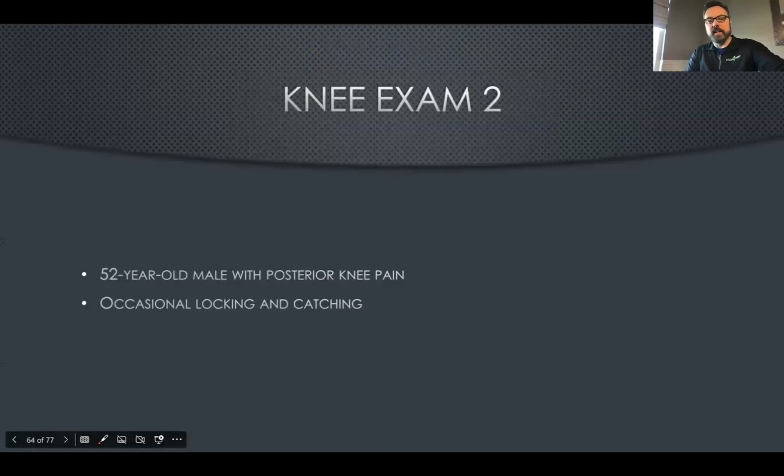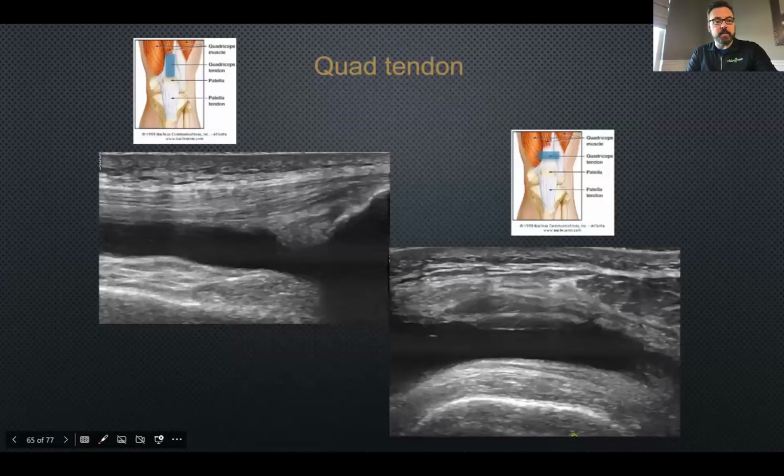Okay. Another knee exam, this case I like a lot because there is MR correlation. This is just above the patella in that suprapatellar recess. You could see it right here as long axis and then short axis. And what we see is this big dark spot. That's all fluid. That's an effusion. And as we know, when we get a giant effusion in the knee, it likes to go to that suprapatellar recess. It goes to the path of least resistance, and that's one of the paths of least resistance, is in that suprapatellar recess.